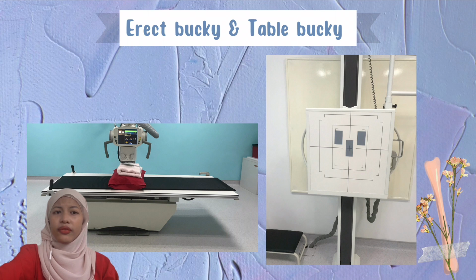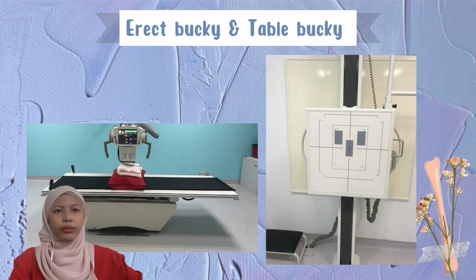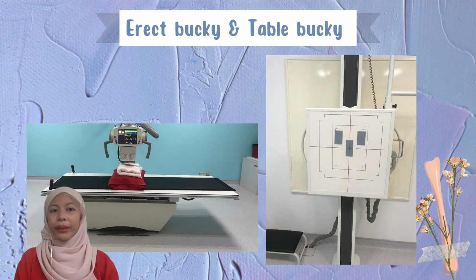So what is the difference between the erect bucky and table bucky? The erect bucky is used when the patient is able to stand or sit, which is called erect projection or semi-erect projection. But when the patient has no ability to stand nor sit, the patient can do their projection at the table bucky, lying down.